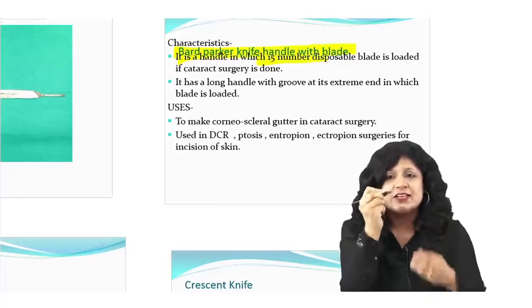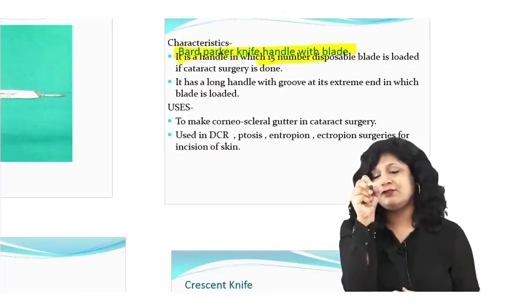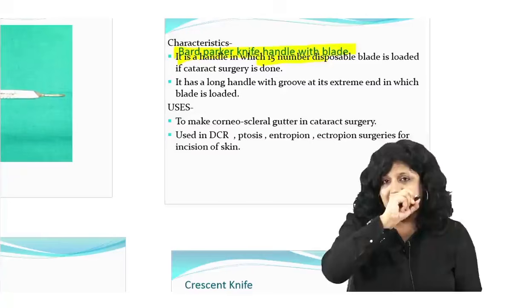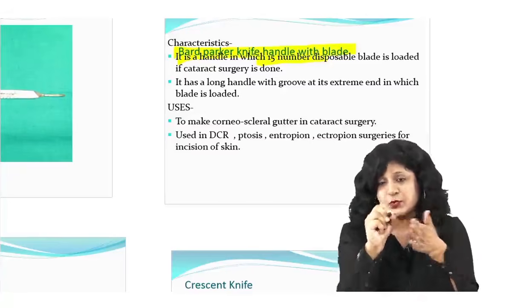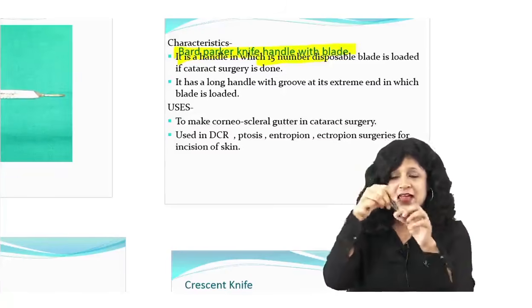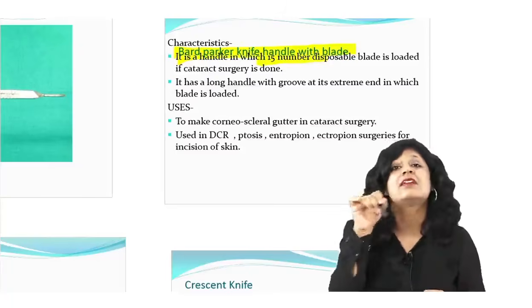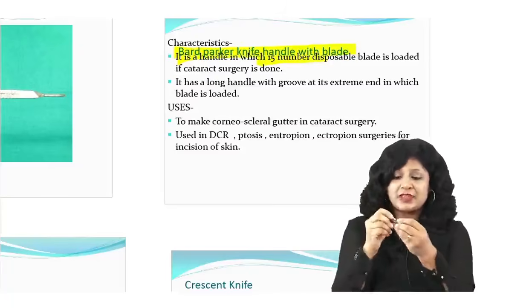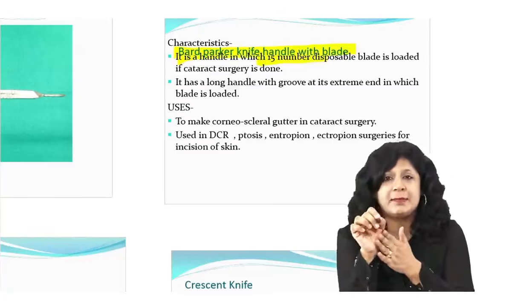The reason is that you have a better grip when you hold the blade in the form of a pen holding manner, and we have command over the steps that we are doing, and we can give the incision. But if you are holding it like this, our hand becomes loose and there can be irregular incisions. So that's a good idea of keeping this blade in a pen holding manner.